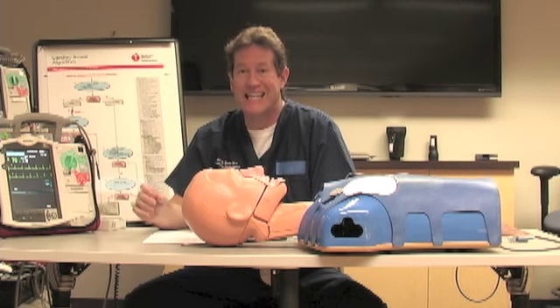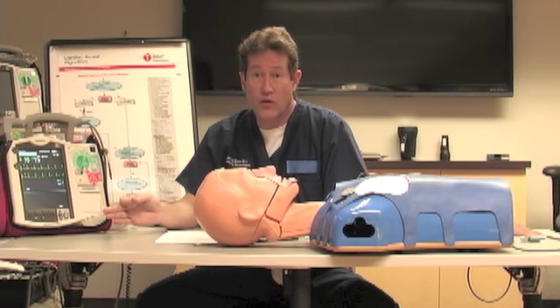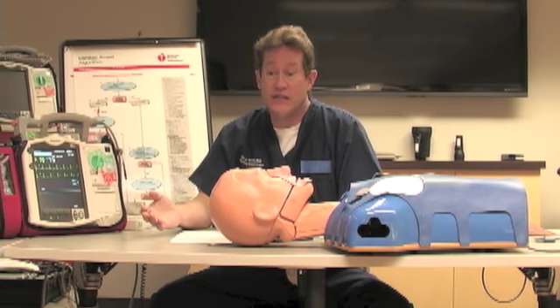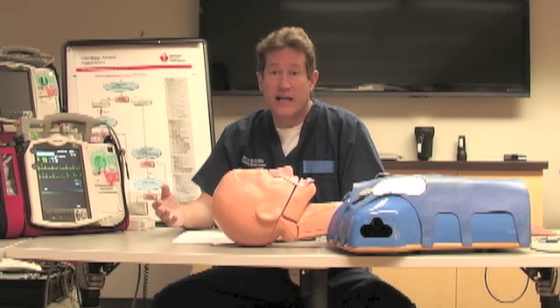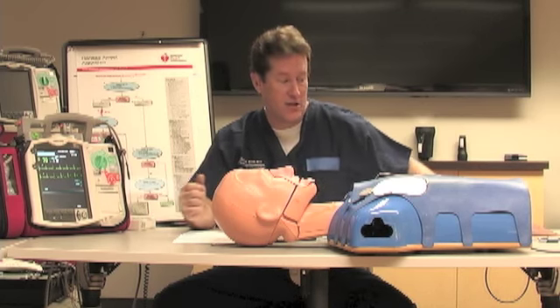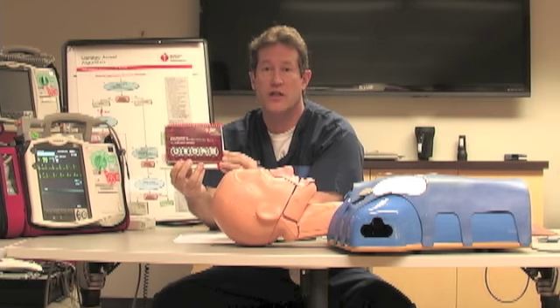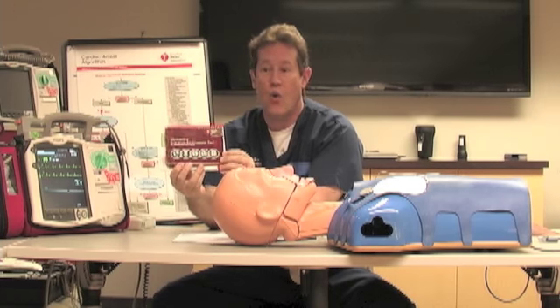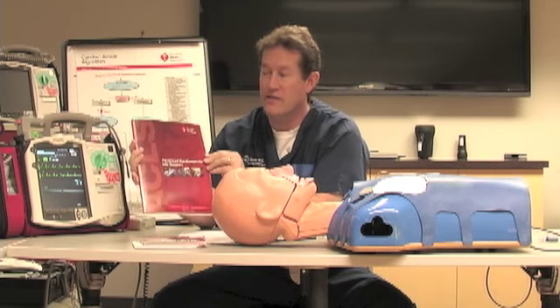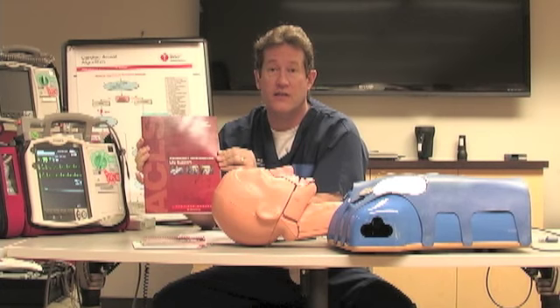So these will be dynamic EKG rhythm strips that you will need to know in preparation for the ACLS class. The ACLS classes that we teach use guidelines from the American Heart Association's latest 2010 guidelines, from this handbook, or instead of the handbook, you have the provider manual, which is from the 2010 guidelines published in 2011.